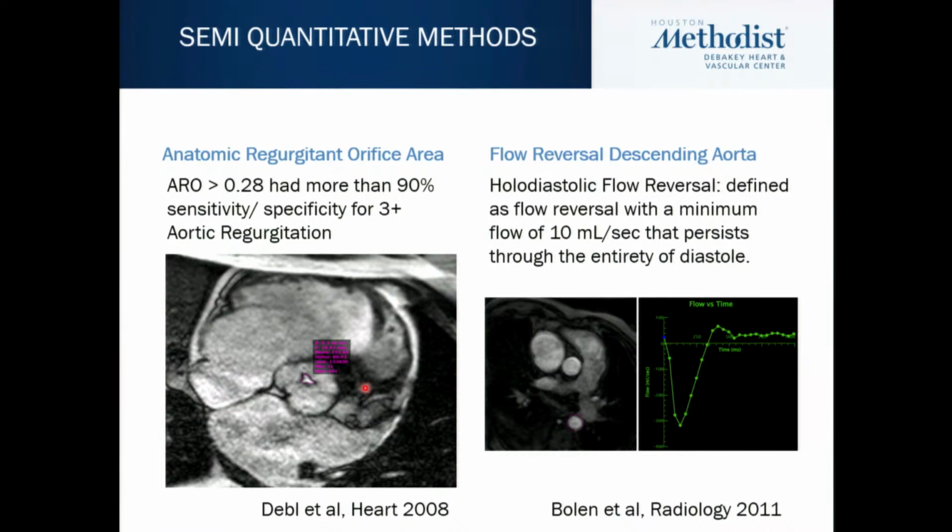So we have not just one, but more than one different way to assess this, and so far it looks pretty convincing that our patient does have significant aortic regurgitation. And our volumes are all consistent with each other using different methods.